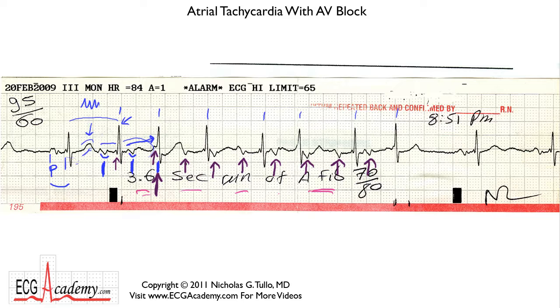Once I point these out to you, don't you notice that they're there? As soon as I put the dreaded arrow sign here, doesn't that jump right off the page at you? You say, oh my goodness, I should have seen that. How did I miss that? So what you have here is a run of atrial tachycardia at 150 beats per minute. But what's happening is the AV node cannot keep up with it. The AV node is blocked up. You have a PR that gets longer. This one blocks. This one conducts with a fairly long PR. This one obviously didn't go anywhere because there's no QRS following it, so that blocked.